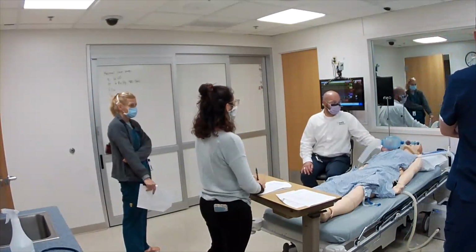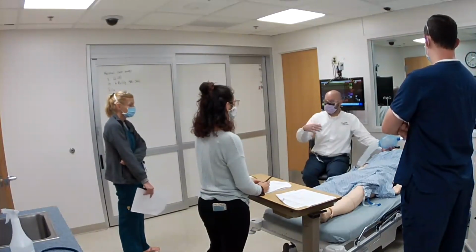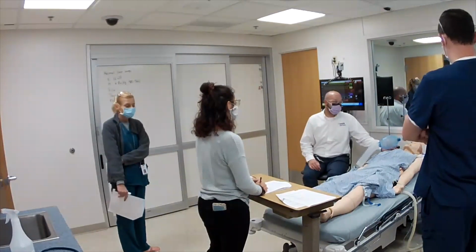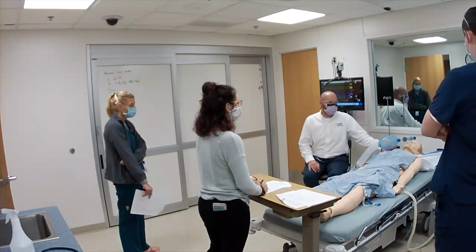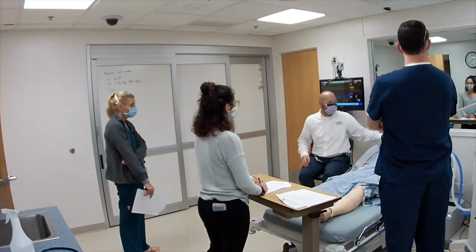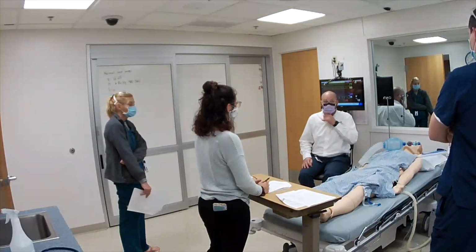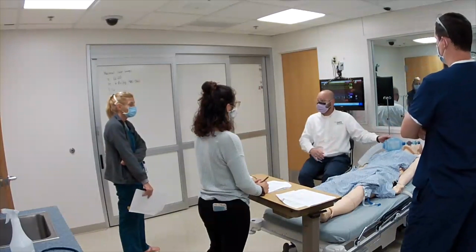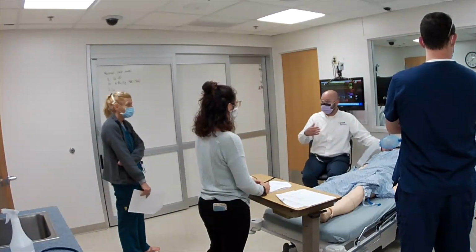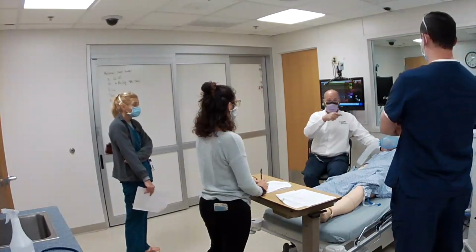So basically, this is two modes of ventilation blended together, right? So in this case, the background mode of ventilation is volume control, right? So no matter what, they're getting a volume control mode of ventilation, no matter what they do. But on top of that, then they're getting pressure support or CPAP. So when they breathe, they get CPAP. When the vent breathes, they get volume control, which makes it really comfortable for them. They're not getting 560 if they trigger a breath. They're only getting what they get and a little help. So it's a really comfortable mode of ventilation.